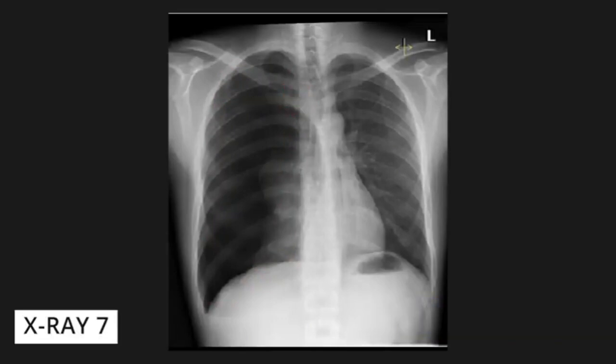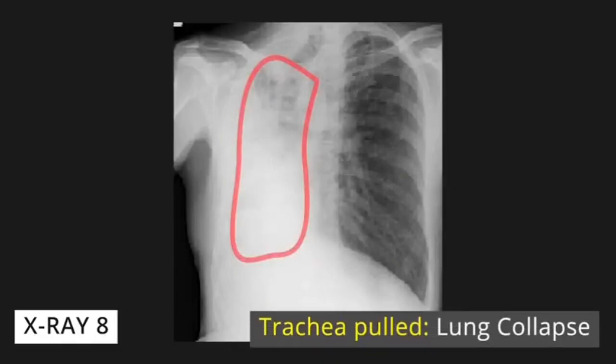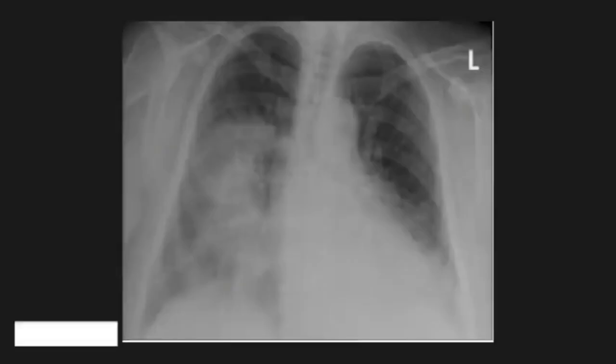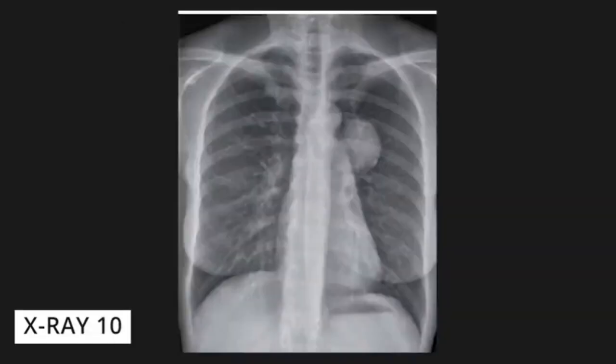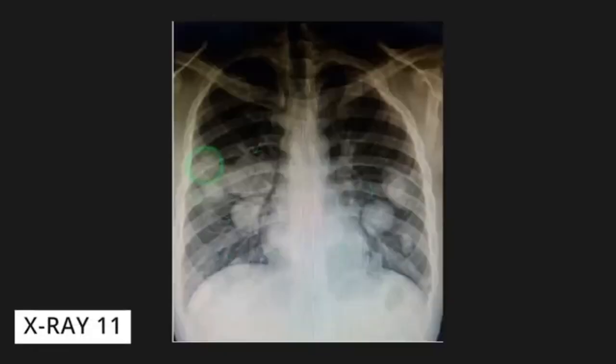It really does. Which brings us to B for breathing and bones. The rule of thumb here is simple, right? Air is black and bad stuff is white. Generally, yes. Dr. Madan highlights some classic visuals. For example, if you see white fluid spreading out from the center of the lungs, resembling wings. Oh, the bat wings. Classic pulmonary edema or heart failure. Got it. On the flip side, if you see a section that is jet black with absolutely no white lines for blood vessels. That's a pneumothorax. Right, air has escaped the lung and is crushing it. And while you're scanning the lungs, you also check the bones. Just tracing the ribs for fractures.